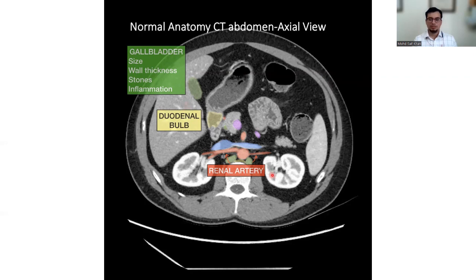But remember, biliary stones are a common cause of acute pancreatitis. The whole biliary system, even the cystic duct, should be examined for stone in CT scan. But for a stone, ultrasound is a better modality compared to CT scan. So stones are better visualized on ultrasound.